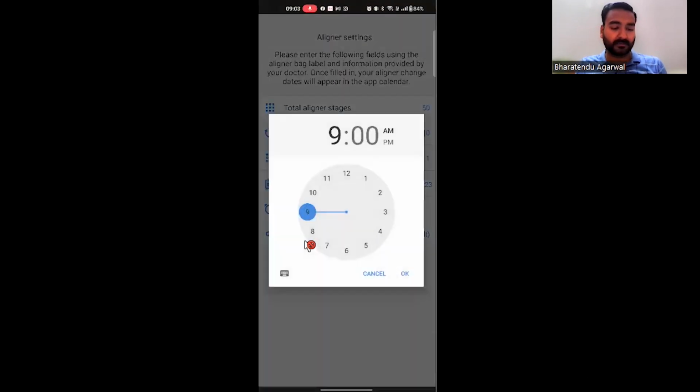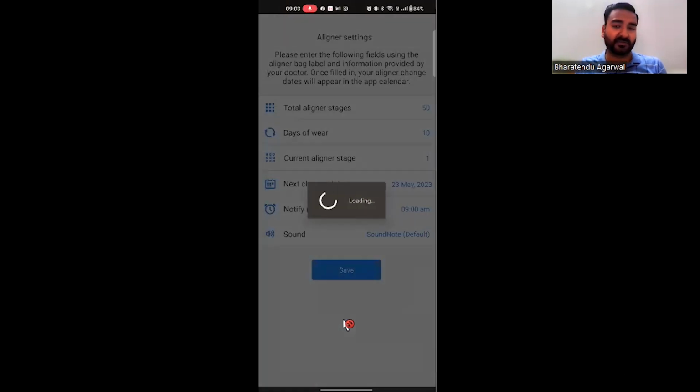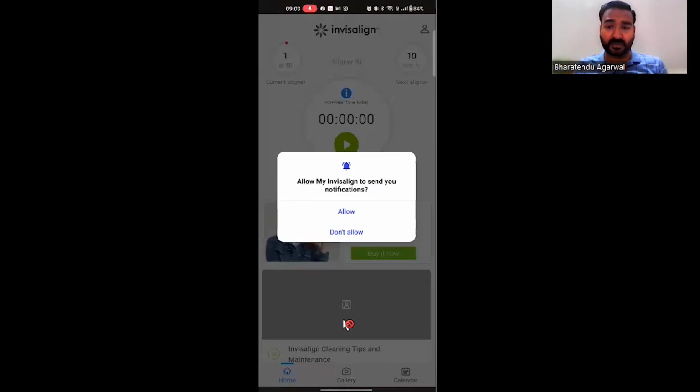Notify me at, all right, you can select the time. So let's say, I think 9 a.m. in the morning is a good time for you to know what's happening. Sound note default, that's it. I don't want to tinker around with that. So I've saved this information. To be honest, I'm not really impressed so far. I thought it was going to be better. So I'll allow the notifications.